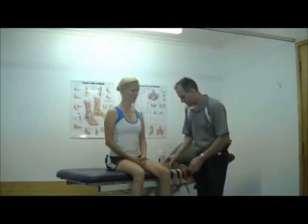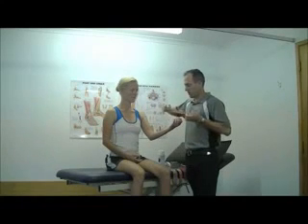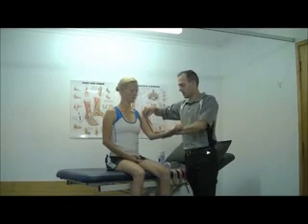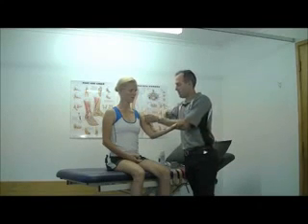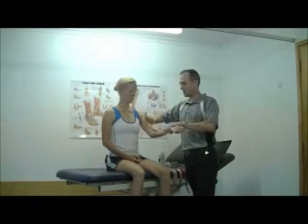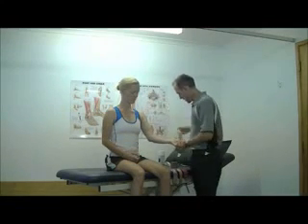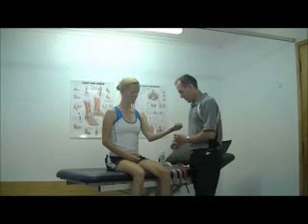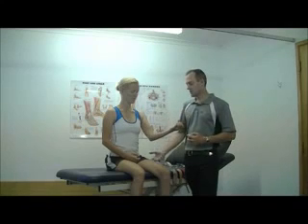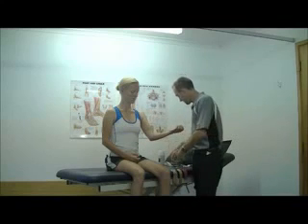With a rigid tape, if we were to tape the elbow in some degree of flexion, as you can imagine, all it's going to do is actually limit the ability to extend the arm. Okay, so it will stop getting into full extension. It won't ever assist flexion. What we can do with a dynamic tape, by using the elasticity, is allow full extension, but with some resistance, and actually now also assist quite strongly into flexion.